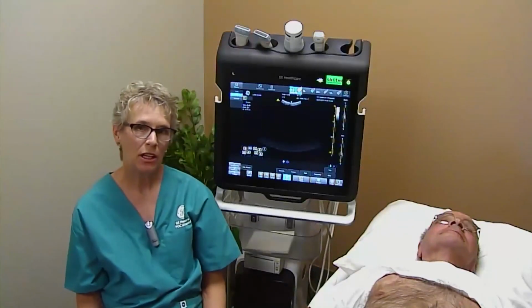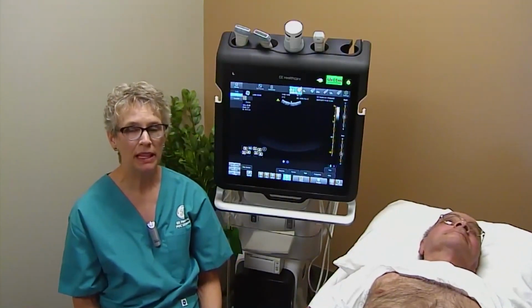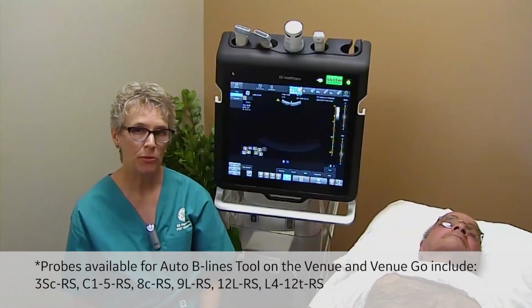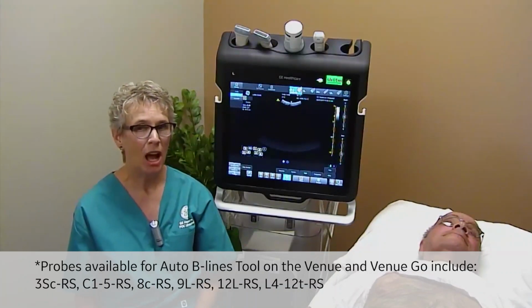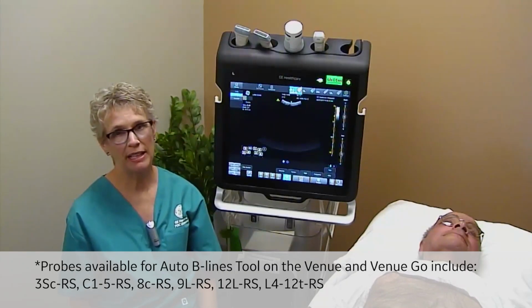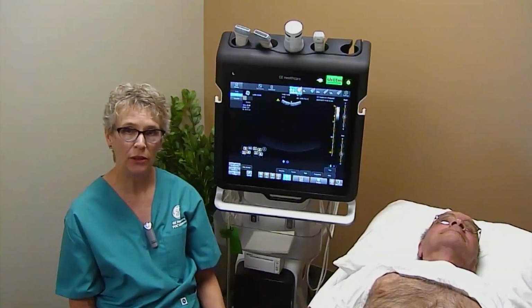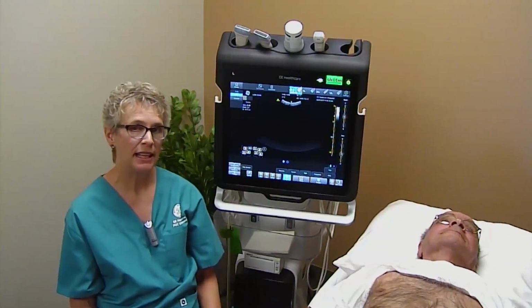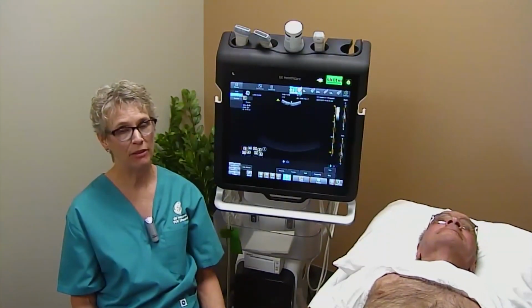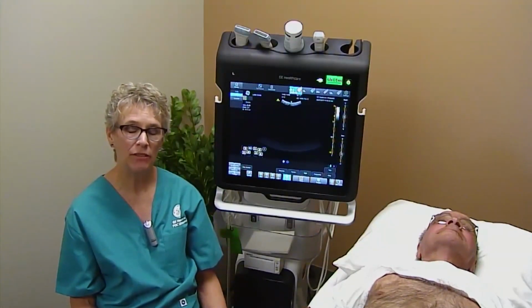All right, so now I want to talk about the effect of probe on the visibility of B-lines. Right now we have the B-lines auto tool working with the phased array and the curved array, and these are our typical probes that are used for B-lines, but all probes are not equal when we come to assessing B-lines. The curved array has advantages in that it shows the pleura very nicely, and it also shows a wide field of view. The phased array has an advantage of really getting in between the ribs nicely, but it doesn't show the bat sign very well, and it doesn't really show the pleura very well, but it will show the extension of the B-lines to the far field.